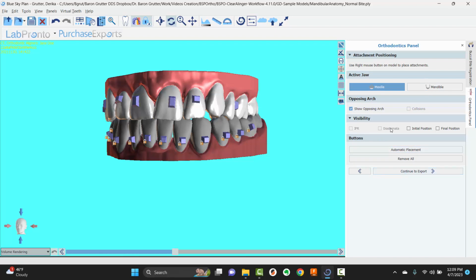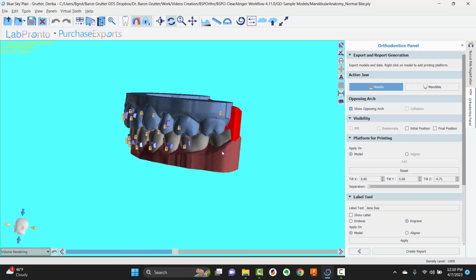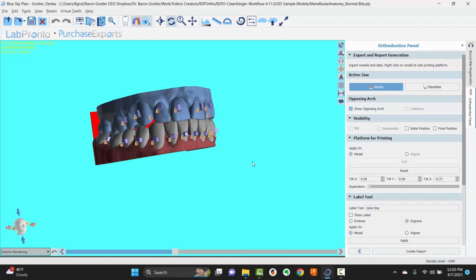Again, I'm not even going to look at the mandible in this video. I'm staying on track so far. I'm at 36 minutes. Last time I did this, it was right at an hour, and I'm really trying to avoid that. Okay, so now, I don't love this canine position, but whatever.